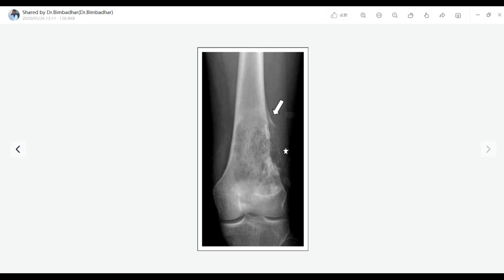Okay, you see here where the arrow has been passed, that one is actually forming up as a triangle where the periosteum has been peeled off. So that's the reason it is called a periosteal reaction. That's true. And again, you are also going to look at the lamination.